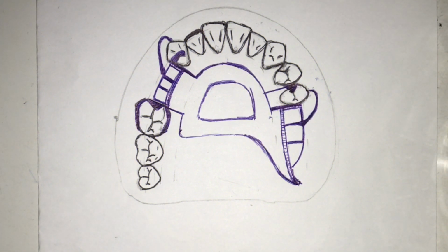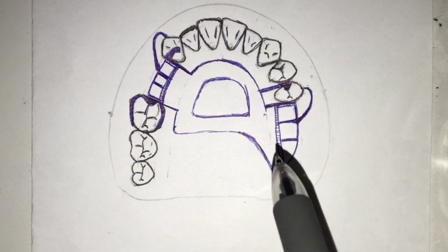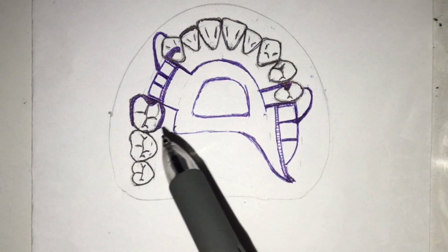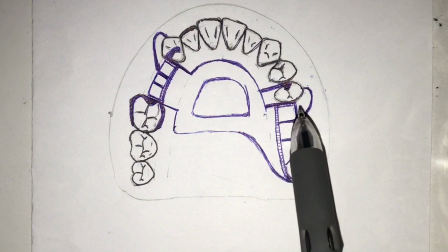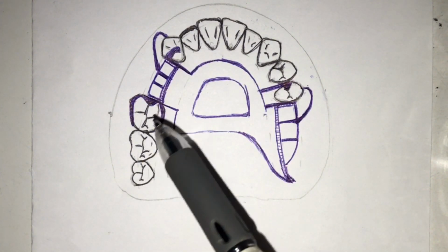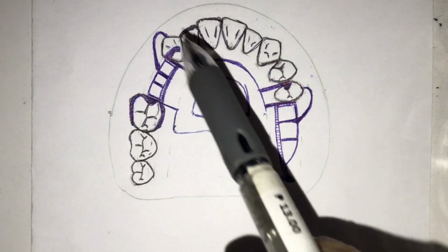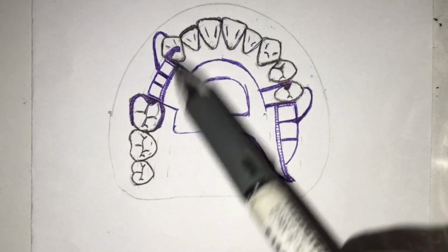Now let's try other cases. Following the steps, of course, we have chosen our primary abutments and placed our rests. And this is my path of insertion. My primary abutments are 1, 2, and 3. After my primary abutments, I placed my rest, this being tooth bounded.